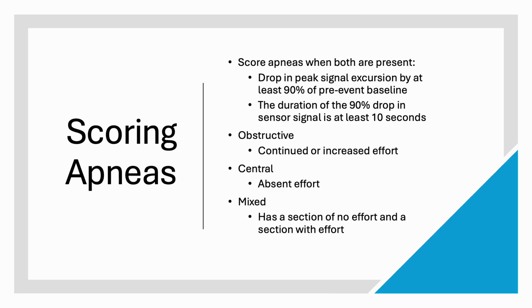That's normal. To score any kind of apnea, which means a cessation, or no breath, you must have 2 things. The airflow signal has to decrease by at least 90%, so we're looking for a close to flat line in the airflow. And second, the event has to last at least 10 seconds from the first irregular or missed breath to the last. There's no desaturation criteria.